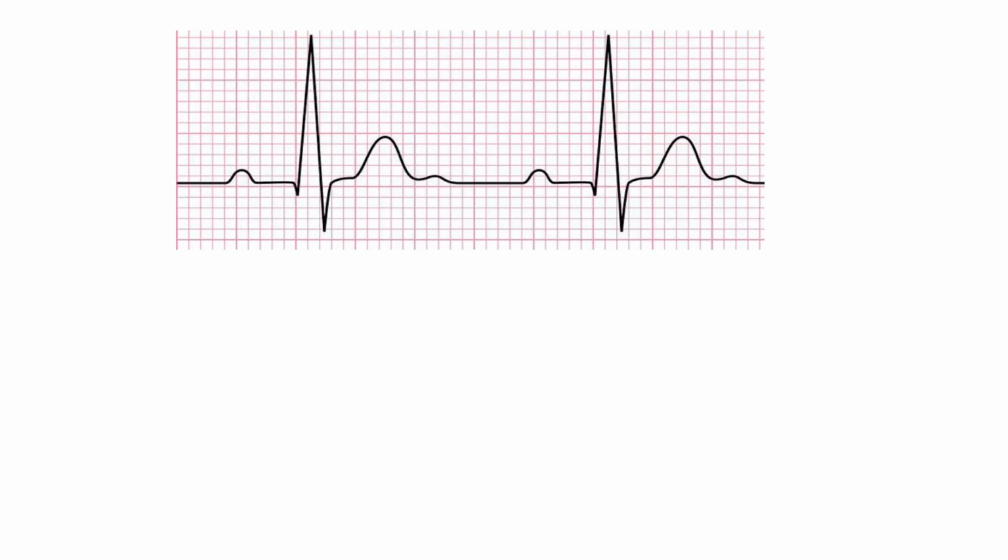ECG Interpretation. This is a brief overview of how to read your ECG rhythms. We're going to start off with our image of a normal sinus rhythm. So you should be able to identify each of the waves seen here.